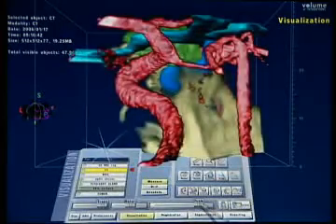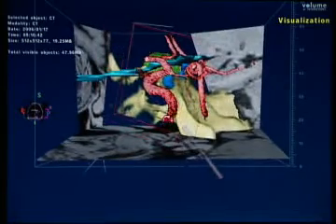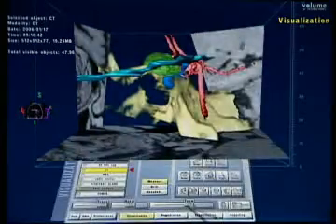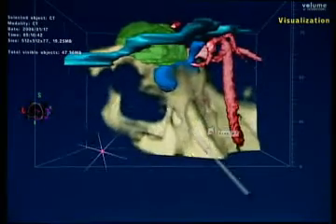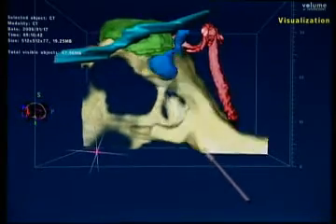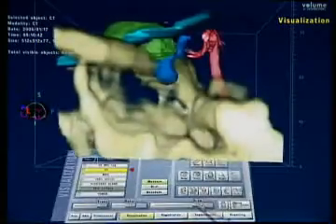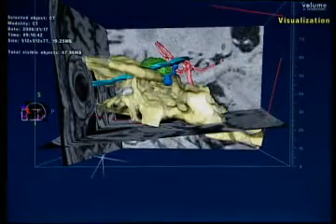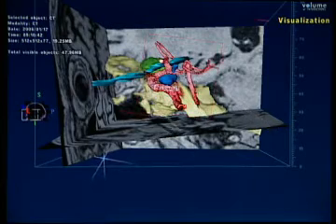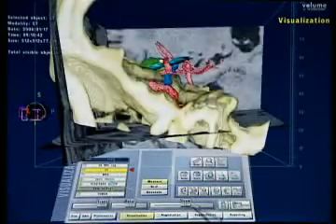So you see I'm kind of using all volume exploration tools, as we like to call them. If you want to crop the arteries a bit, because you want to see the relationships to the skull base a bit more, and you don't want to be obstructed by the left ICA, of course I can take it away, as I just did. And this would be looking at it straight from lateral now. Okay. I'll put the vasculature back on. There you go. So you see, I'm working naturally in 3D all the time.